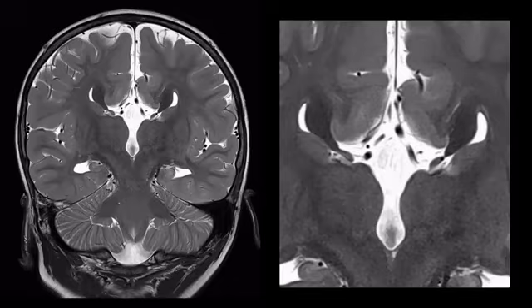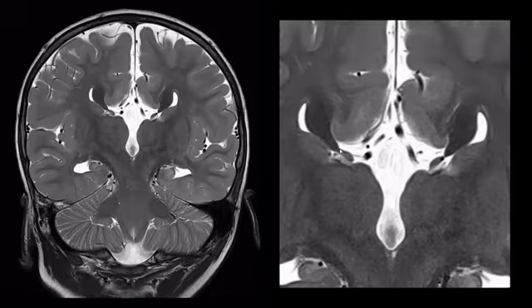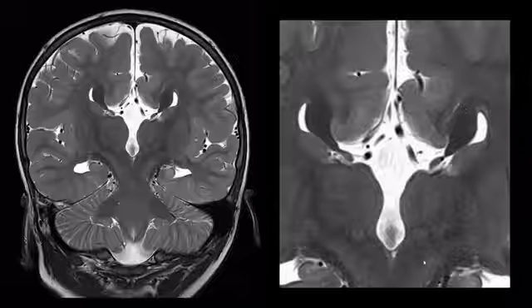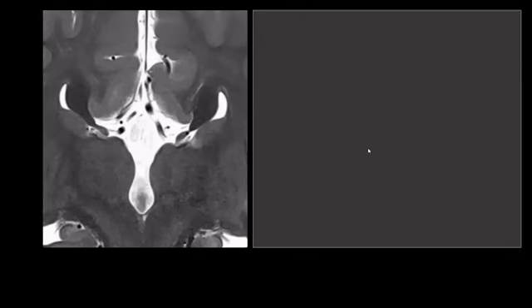And this one goes under many names. Let's go over them all. Well, first of all, what is missing normally? Here we see these two white matter bundles. These should be connected to one another, and then it's the corpus callosum. But because there is no corpus callosum, white matter has developed into two thick bundles running medially of the lateral ventricles, causing this bizarre morphology, and these are called the Probst bundles. So these are basically the axons that want to cross the midline, but they can't, so then they just run medially of the lateral ventricles.